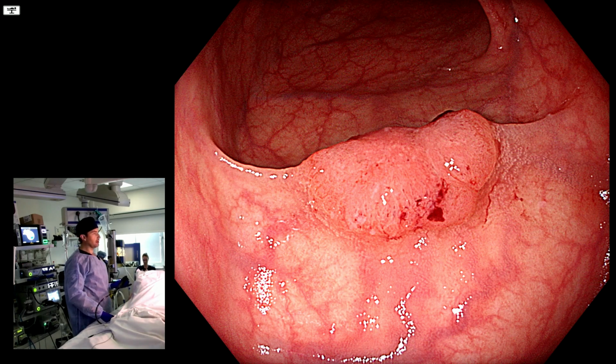Now, what are the 6 blink features? Well, they are fold deformation, extra redness, ulceration, spontaneous bleeding, depression, and chicken skin mucosa. I just read those, but you should have them on your computer screen, like I have them nicely attached to the computer screen in here. And why should you? Because they allow you to shortcut your thinking about colorectal polyps so that you can immediately identify visual cues of cancer.